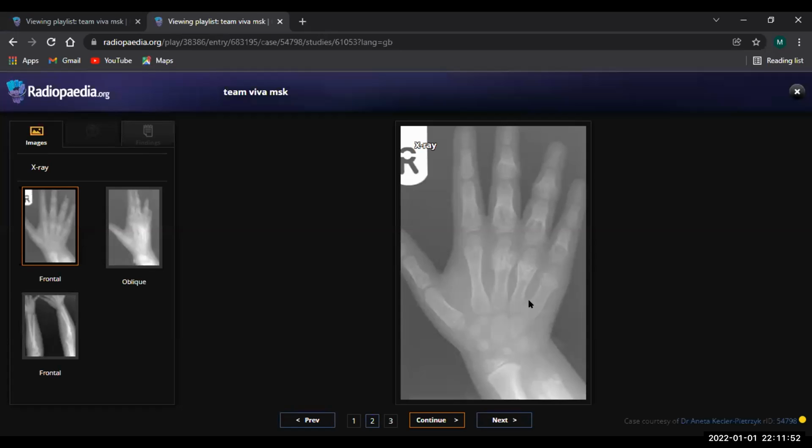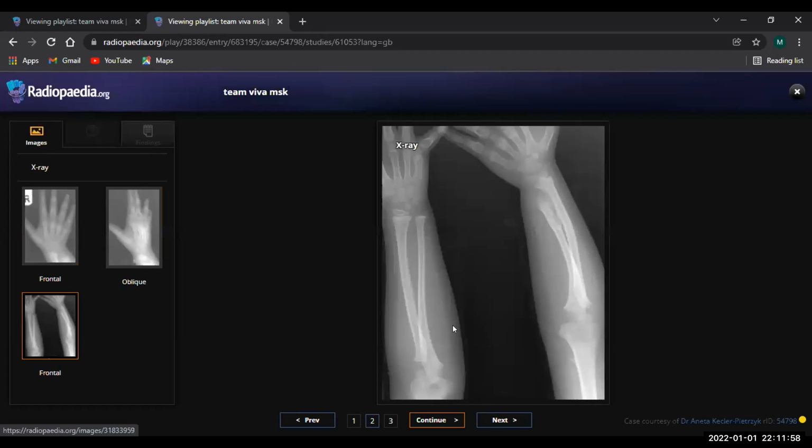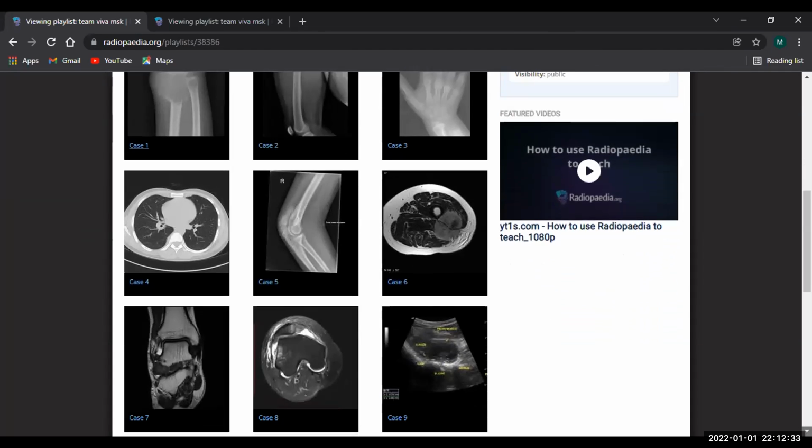They appear short. Also, the ulna on the same side appears short. So I'm thinking of multiple enchondromas in this patient. These can cause length discrepancy and the expansile lucent lesions we're seeing, and also benign. Ongoing pain could be due to the ulnar negative variance.